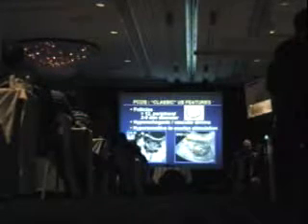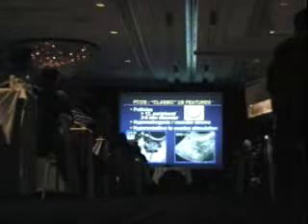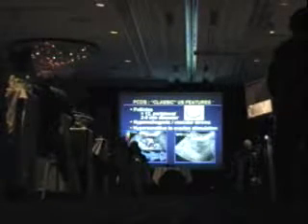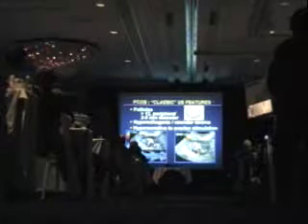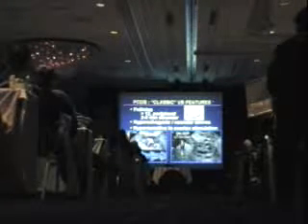Here's an example of a woman with polycystic ovaries, somewhat large and spherical. I draw your attention to how much color there is and a lot of Doppler flow. Now, if I gave you 100 women whose ovaries had peripheral follicles without a dominant follicle, would you say 100 times it would be polycystic ovaries? Not really. The most common cause for an ovary to look like that is not polycystic ovary.